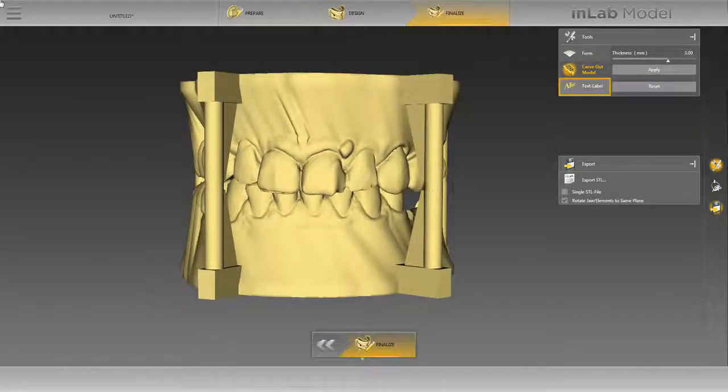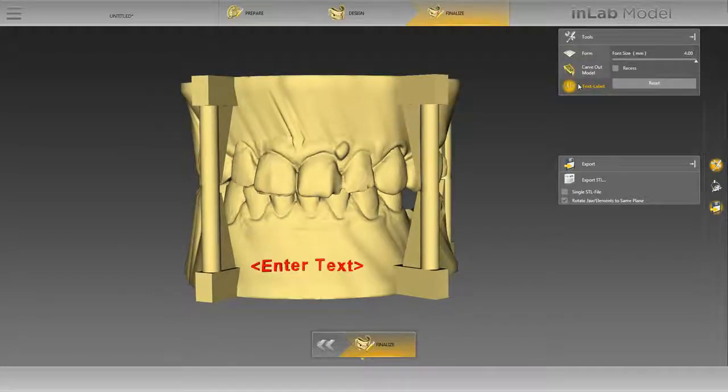Next, we activate the Text Label tool and use it to add text to our models. To do so, we move the cursor to a suitable location and type in the desired label without clicking again. You can use this tool to assign models to patients, for example. In our case, we write implant. Double-clicking will confirm the label and allows you to add further labels.